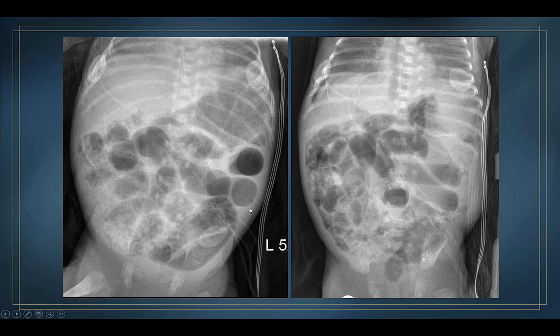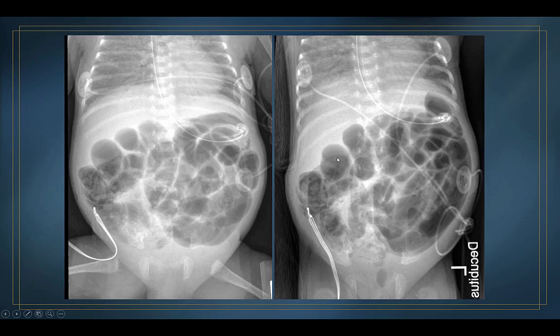that I don't think you can even see on the supine view of the abdomen. Just to warn you, obviously this patient has, again, asymmetric bowel distension with probably multiple loops of elongated dilated small bowel. He's got pneumatosis in the right flank. But just be careful. Just because the technologist labels it left lateral decubitus doesn't mean it is. You can tell by the fluid level in the stomach it's really a right lateral decubitus.